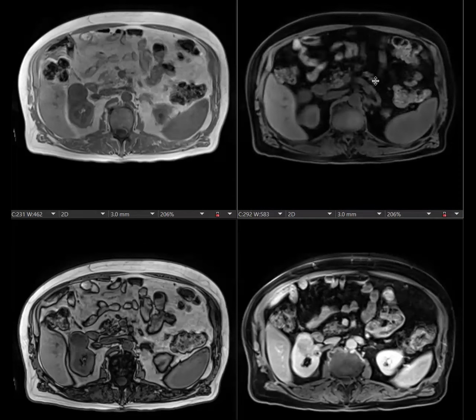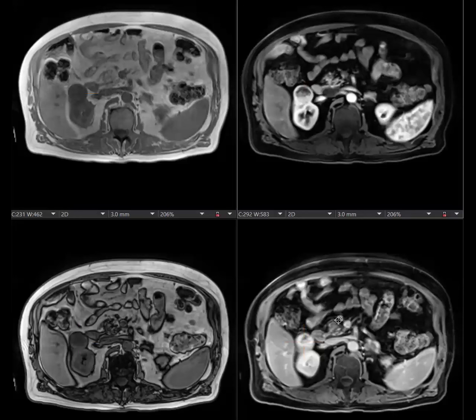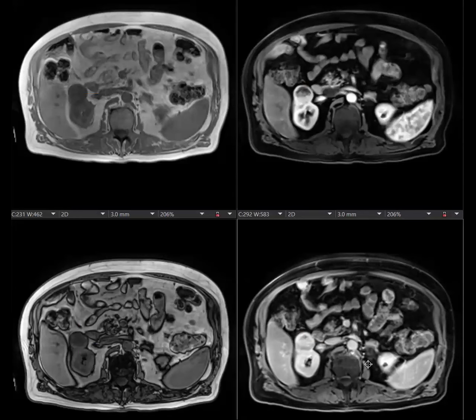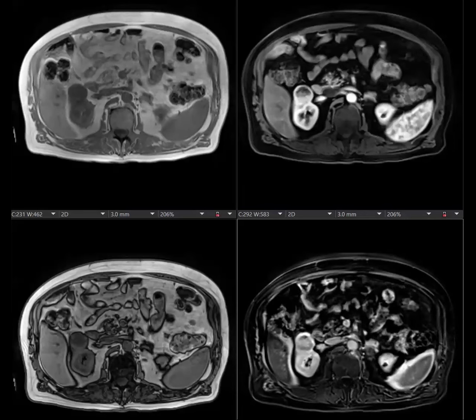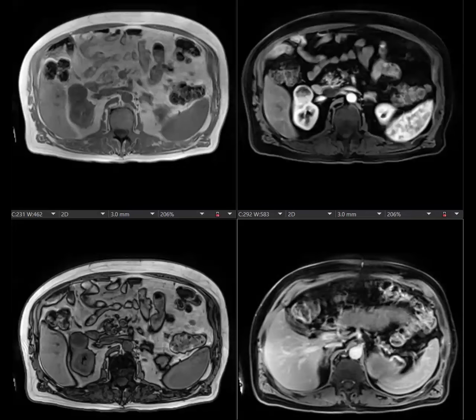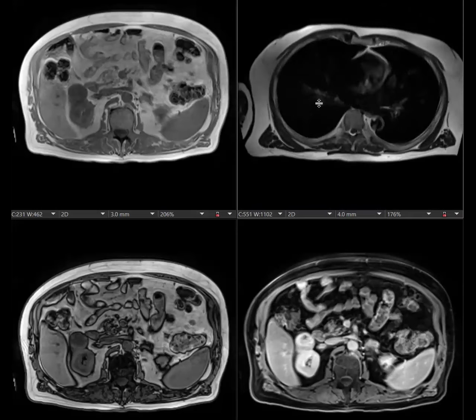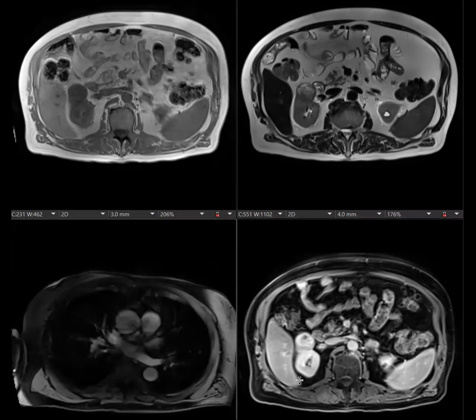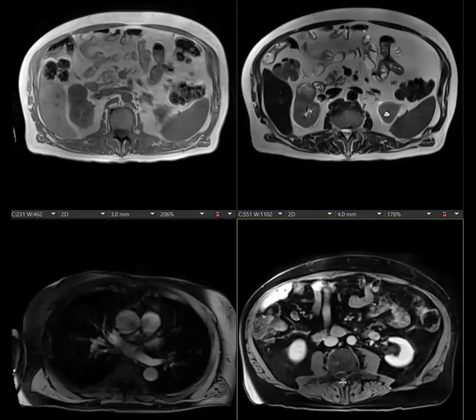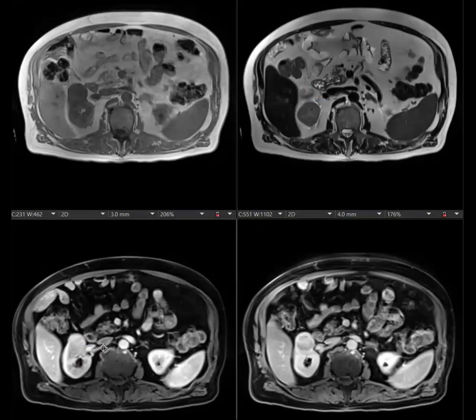So here's your pre, and then your arterial. Okay. And this is your 5 minute. Here's the subtraction, 5 minutes right there. All right, a little bit of misregistration, a little bit of motion too. T2 is right here. If you kept up that arterial and the delayed side by side, are we seeing arterial here and delayed here? Okay, side by side. Are we seeing segmental enhancement inversion? I don't think so, but you tell me.